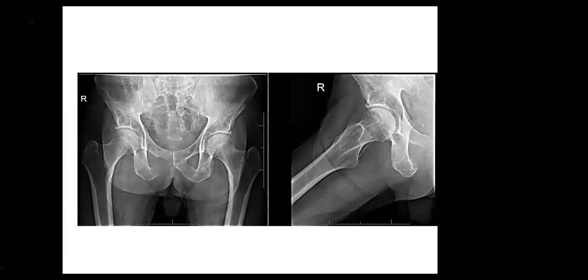This is a pelvic radiograph involving the pelvis and both hip joints of a skeletally mature patient.